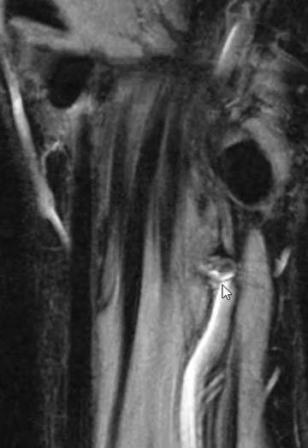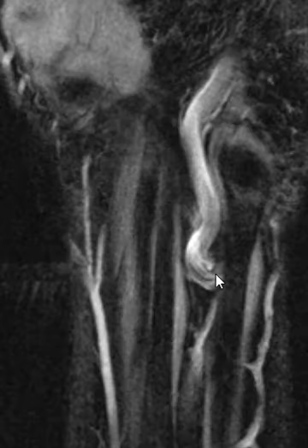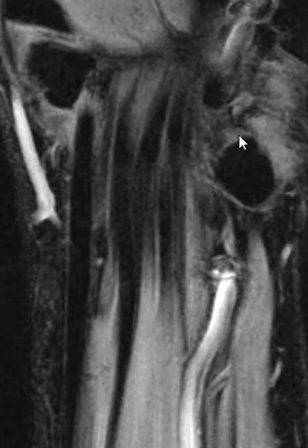These are thinner images, smaller field of view with better image quality. We can see this ulnar artery going up, making a loop upon itself and going back up here again and ascending. And we can see here the hamate bone, the hook of the hamate bone, and the pisiform bone. So in this region, the Guyon's canal, the vessel looked normal. No aneurysm, no dissection that I could see.